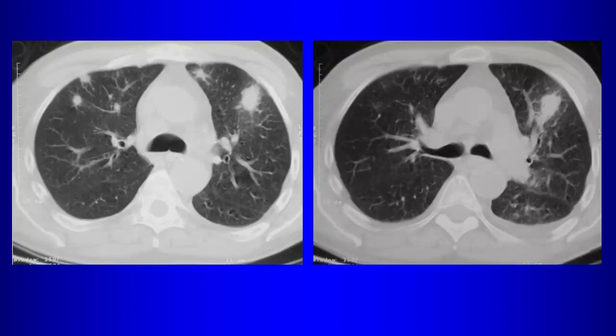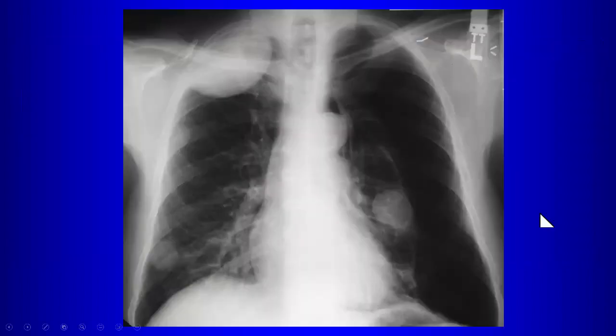Hemorrhage. So what tumors can give you hemorrhagic metastases? You think of vascular tumors, thyroid, renal cell, what else did you mention? Melanoma, choriocarcinoma, right, so in females, choriocarcinoma. So hemorrhagic metastases can also give you ground glass halos. But this was a neutropenic patient, and this was an example of invasive aspergillosis.